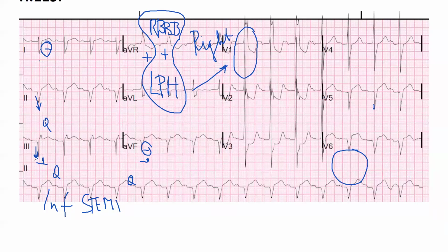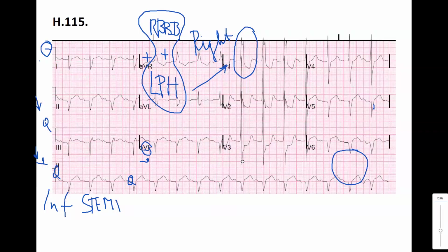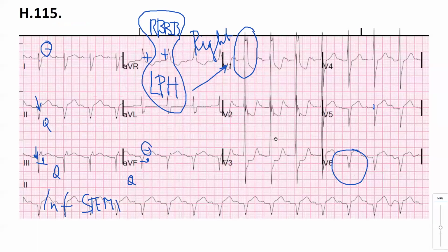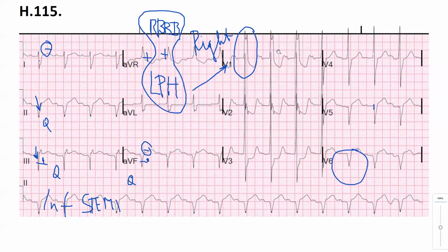Next one, let's look at the size of the R. It's very tall, especially tall on the right side and deep on the left side. So what can it be?